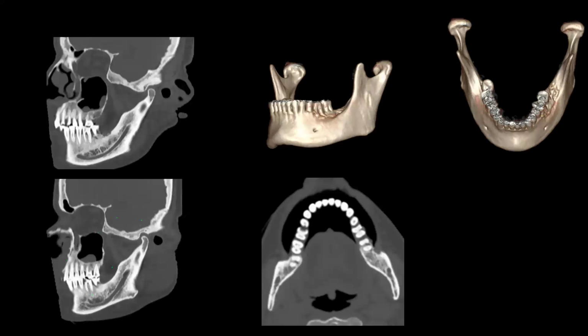In RMT, we have to be sure that there's no cortical erosion. This is the normal side, which is the right side. This is the abnormal reconstruct. So we can see cortical erosion here. So this is an RMT lesion, superficial bony erosion. And we can see these oblique sagittal images, how nicely the inferior alveolar nerve is appreciated.